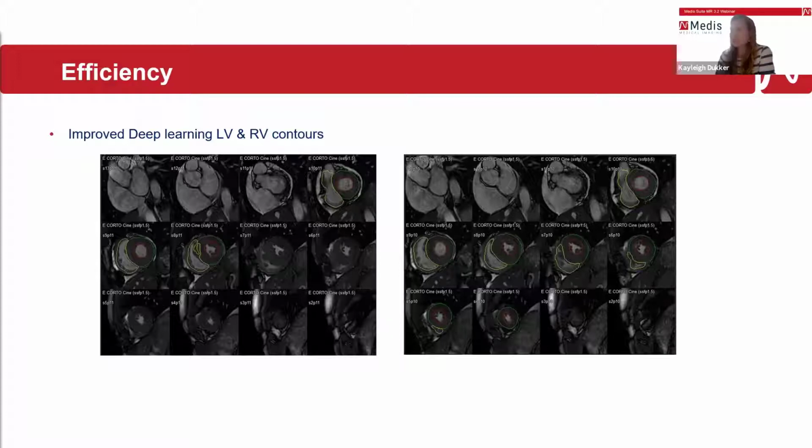You're seeing here on the screen an example of one Canon case where you can see clearly the difference between the pre-contour detection algorithm and the one afterwards. The differences won't be that large for each data set, especially if the contours were already quite good, but especially for the Canon cases, you can see that there's a huge change in there as well.